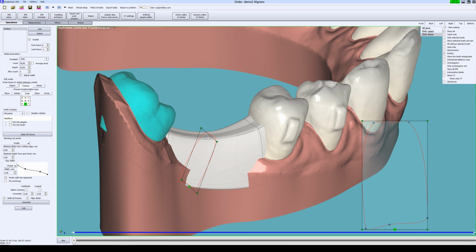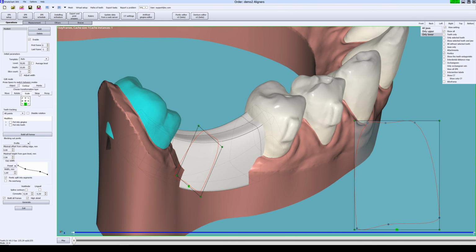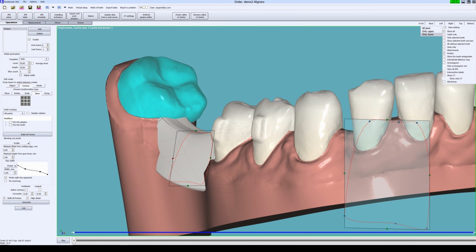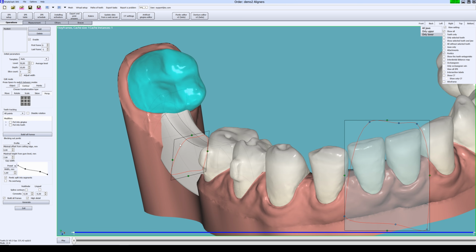The scale tool uses the same rotation center but as a scale center. The next tool is skew. The next tool, perspective. You see how it works with additional commands.